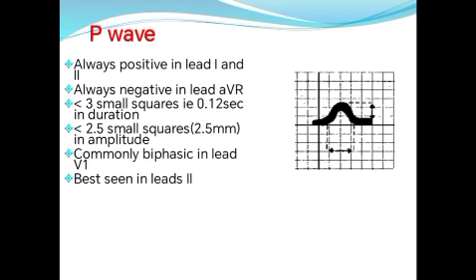After that we come to the axis and the duration, the intervals of the PR, QRS, QT, and then we come to the shape of these waves, P wave, Q wave, R wave, and like that, to determine if there is any abnormality. This is the sequence of how we read the ECG to determine the abnormalities. Now, here we are going to talk about the P wave.